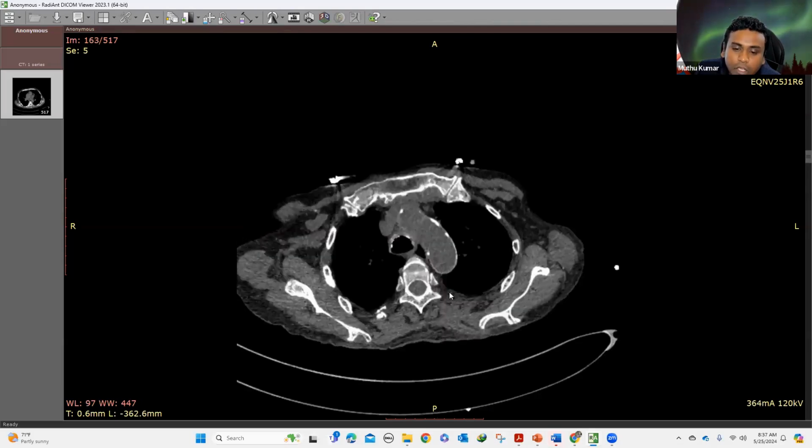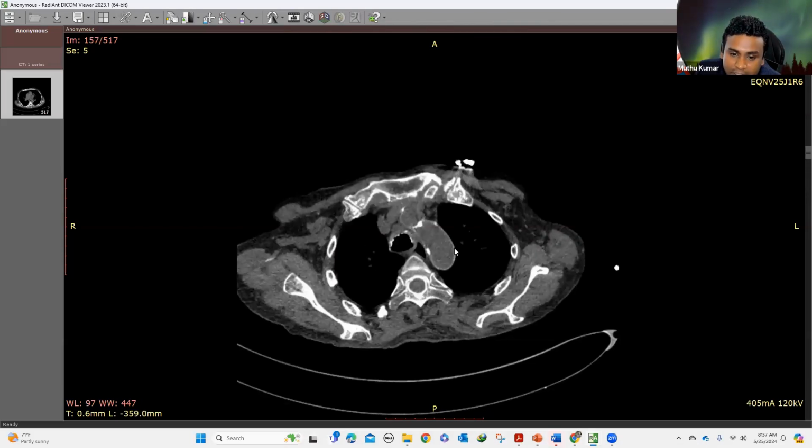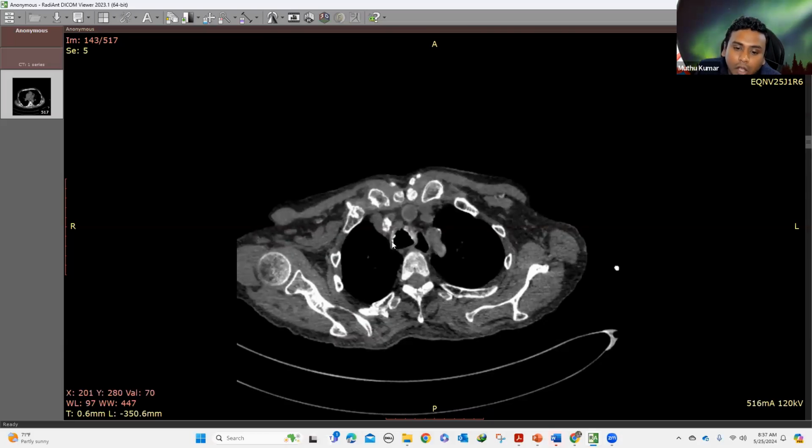tracheal margin. When you see pathology limited to the cartilaginous portion of the trachea, and especially if it is associated with thickening, you have a very limited diagnosis. In this patient, because there are ossified nodules extending into the lumen of the trachea, TPOP is the diagnosis here. Relapsing polychondritis can have calcification, but it will never go into the lumen.